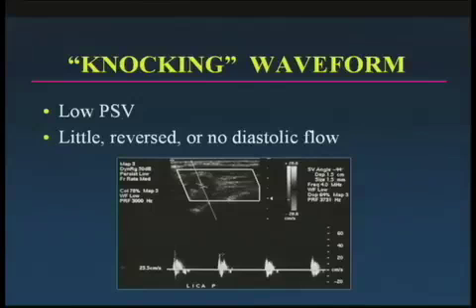I mentioned the knocking waveform. Again, just to refresh your memory, low peak systolic velocity, little to reversed or no diastolic flow.